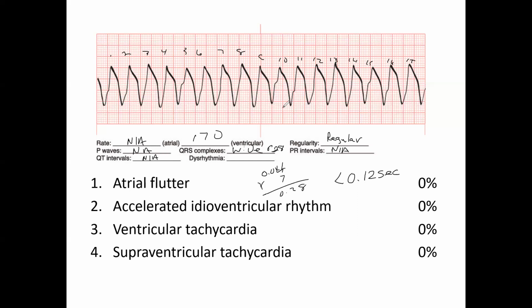So knowing what we know about the rhythms, we know this is a ventricular rhythm. It is tachycardic. We'll say that the patient has a pulse, so this is ventricular tachycardia with a pulse. Specifically, this is something called monomorphic ventricular tachycardia, and it's monomorphic because these are uniform in shape. All these are uniform in shape. If it was polymorphic ventricular tachycardia, you would have almost like a helical DNA strand. It would get really wide, then narrow, then wide, then narrow.